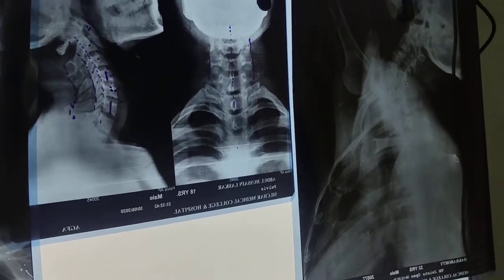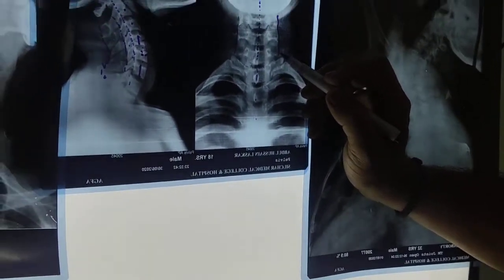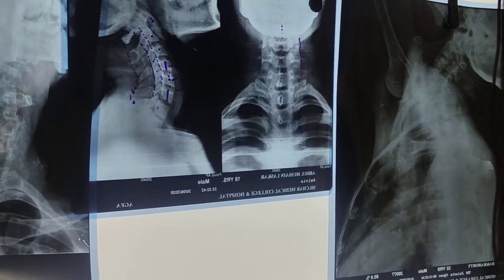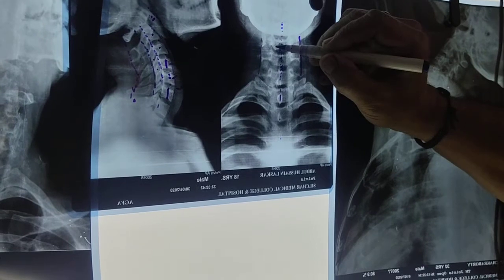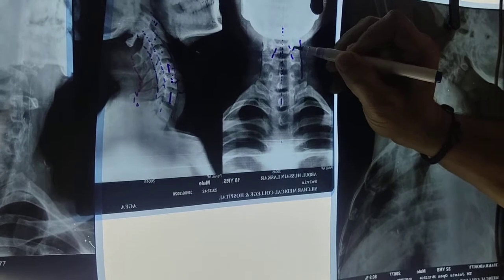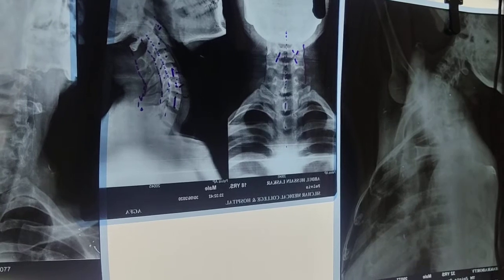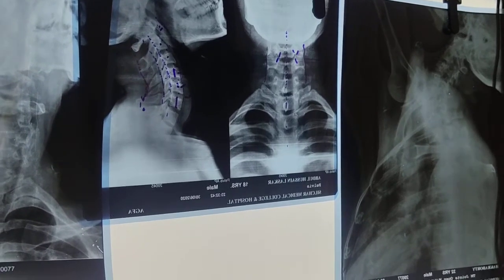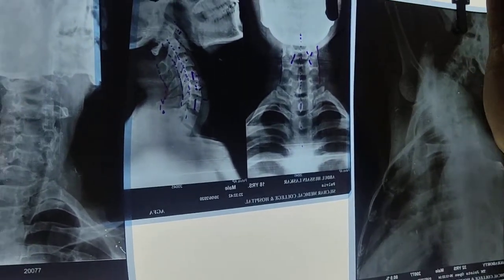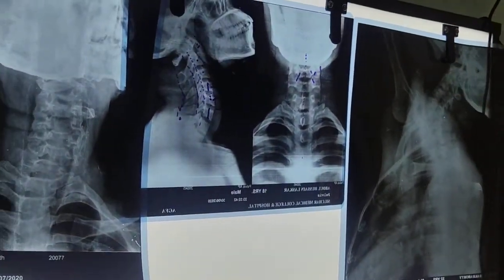That is important. On the other hand, lateral translation of the vertebra is indicated by the lateral border, and also in this part you look for the intervertebral disc. Another thing you are trying to see is called the uncovertebral joint. This part going upward is called the uncovertebral joint, or joint of Luschka. This is an important point from the surgical point of view also: while you are approaching from the anterior side for disc removal, there is a limit, you do not go beyond the boundary of the joint of Luschka. This is a boundary that limits your lateral surgery.